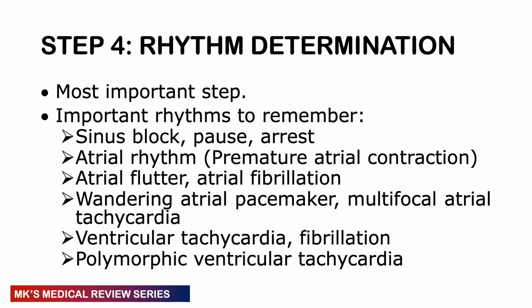I like to put rhythm first. If you see most ECG videos, they'll tell you to first calculate the rate, then come to the rhythm, but remember that your rate is going to be dependent on the rhythm of the ECG. So I like to think of the rhythm before I look at the rate. So I'll do a quick assessment of the rhythm, then I'll come and calculate the rate, then I'll go and do an in-depth assessment of the rhythm again. So this is the most important step, and remember that there are some rhythms that we'll talk about after we finish interpretation of the ECG on separate topics on their own.